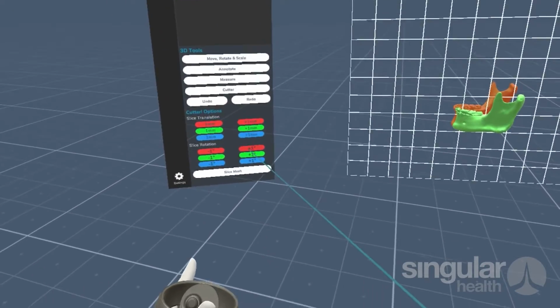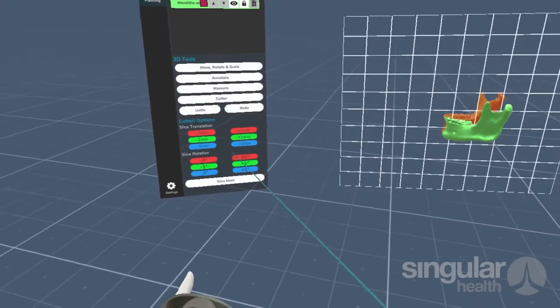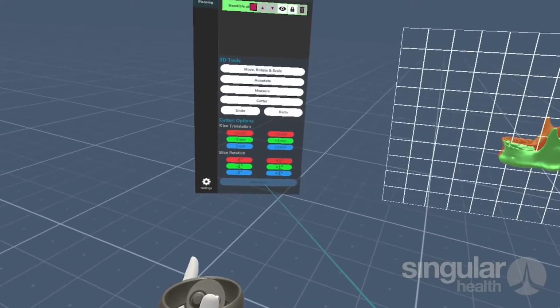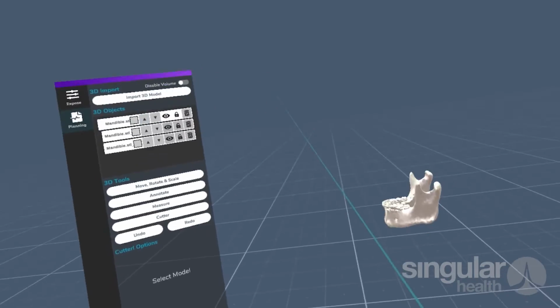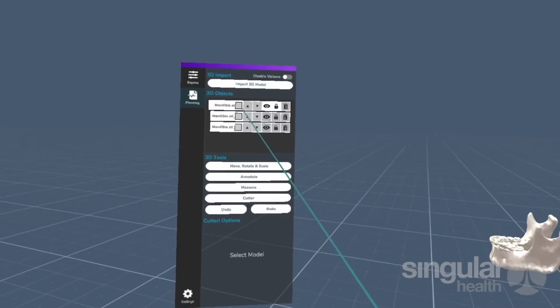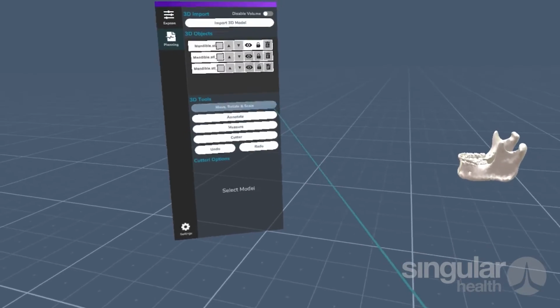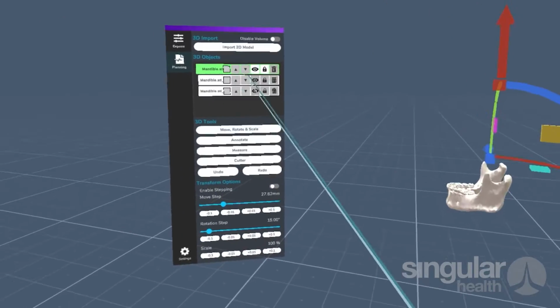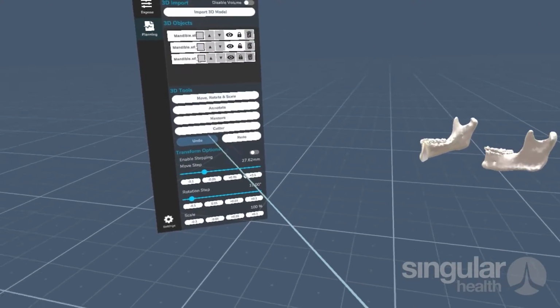You can fine-tune it by adding rotations across, or you can move it in translation as well. And once you're happy with your selection, you can simply slice the mesh. As you can see, the hierarchy automatically adjusts. So we have the parent hierarchy, which is if we want to move everything, we can simply select the parent and it lets us move everything, or we can select the children and move those.